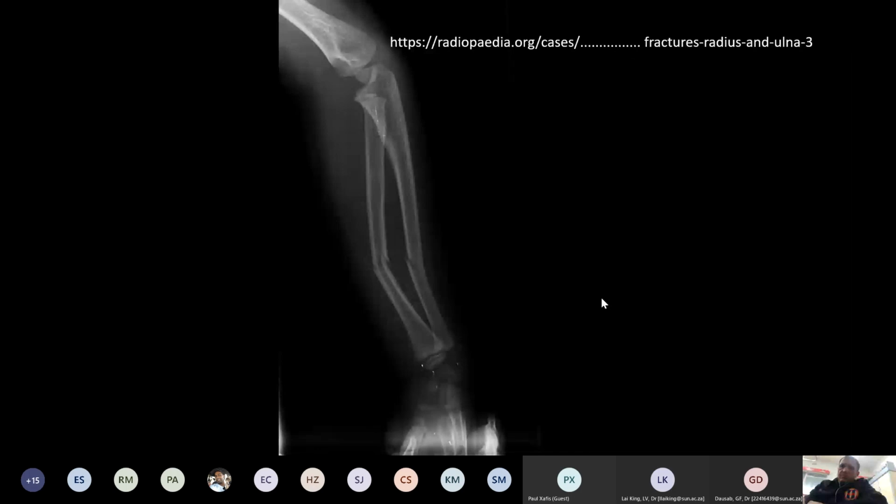All right, typical injuries in children. This is an example of a greenstick fracture. A greenstick fracture is a unilateral cortex fracture. One cortex stays intact, which is visible in this X-ray on the ulna, and the other cortex is fractured, and it could be angulated, but in most cases these fractures have a good outcome. This X-ray is a little bit more complex than that, but it's just to demonstrate a greenstick fracture.